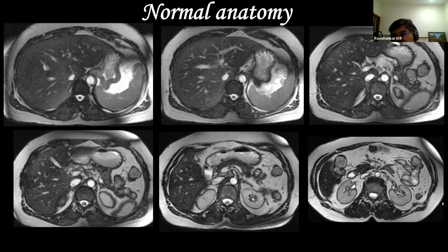That is why it is so important on MR, especially on the 3 Tesla magnets. If there is the slightest movement, even the ascitic fluid looks very nice on a 1.5 T, but on a 3 Tesla you see there is shading. It looks dark, because of the movement there is so much noise. This noise gives that black color to the ascitic fluid.